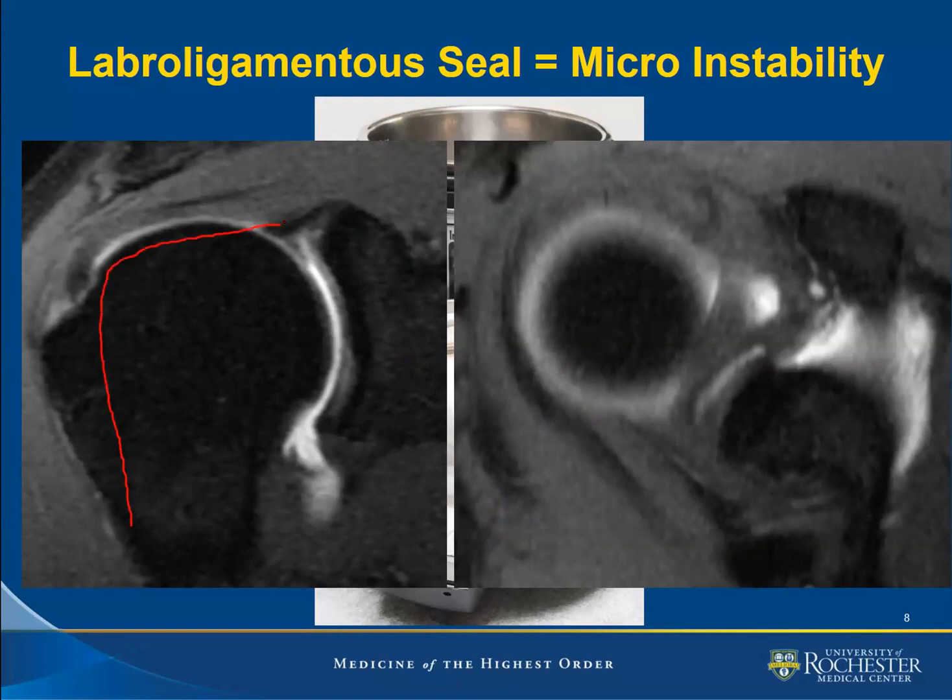An important concept to understand is that the biceps tendon is coming up in the bicipital groove and inserting on the superior labrum and supraglenoid tubercle. And a common injury mechanism that's going to involve your labrum and create these labral tears is the idea of a peel back mechanism. When a patient places their shoulder in the extremes of external rotation and abduction, it creates a torque-like motion on the biceps tendon, which will create a force in the posterior direction on the superior labrum.